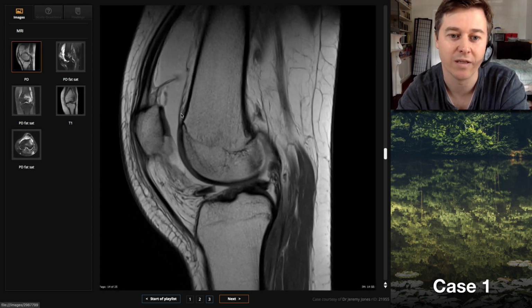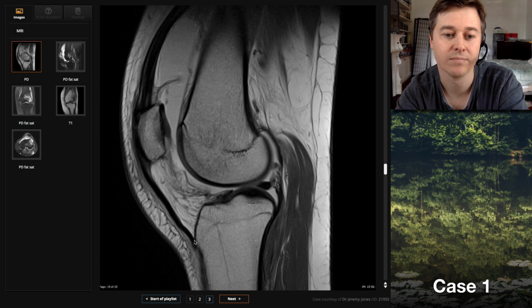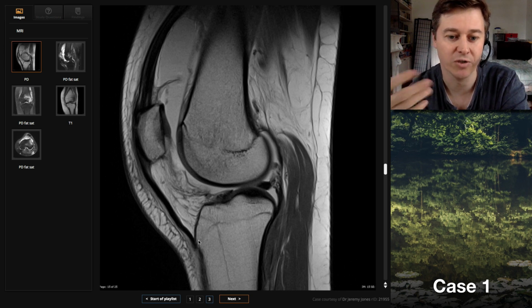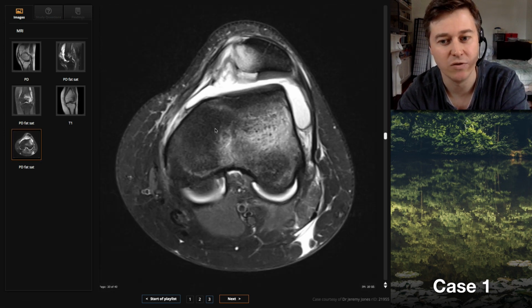And then what would be the other thing related to the patellar tendon? So patella alta and measuring the Insall-Salvati ratio. Yeah, you can see here that the tendon's quite long relative to the height of the patella, so there's probably patella alta as well. So those three, trochlear dysplasia, lateralization of the tibial tuberosity and patella alta, predispose this person to dislocation. And it's quite common for these not to be recognized.